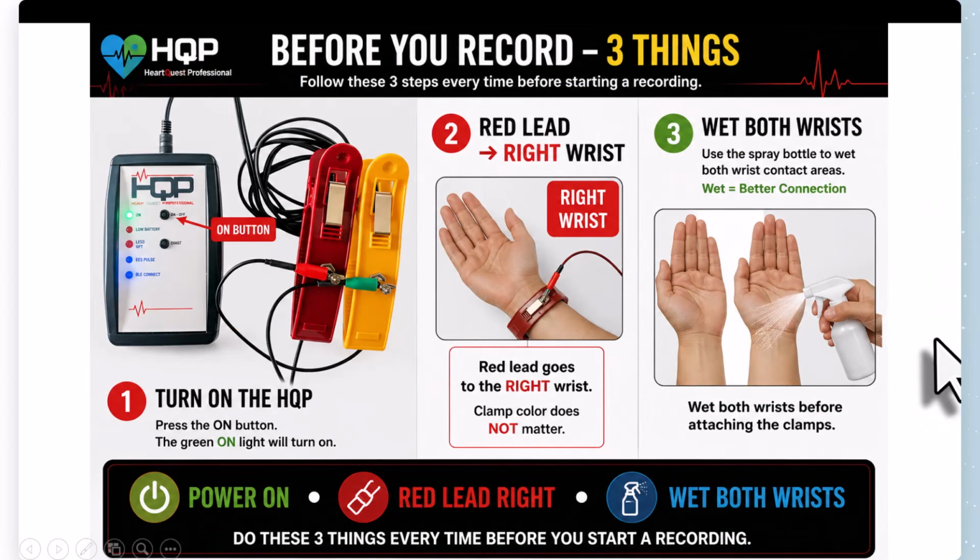Dr. Bicchetti, do you want to tell them a little bit about it, because some people are new. Sure. So there's a couple things you need to do before you can record a test on somebody. First of all, you'll see on the left, we've got the actual HeartQuest device. You will press the on-off button, and that will light up in green. The next thing you'll need to do is make sure that the cord is inserted into the end of the HeartQuest device, and that the metal pieces on the end of the cable leads are inserted into the holes on the clamps themselves, and it is screwed down tight.